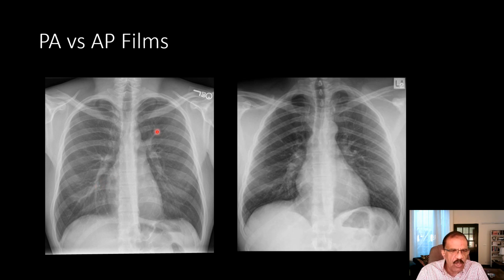Alright, so you have seen this, and now you examine the chest cage on both sides. So if I look at this one, I don't see any problem. The chest looks like a normal shape. This is the normal shape of the chest, and there is no deformity, no fracture, no erosions. I don't see any problem at all. So after seeing the chest, then come downward.